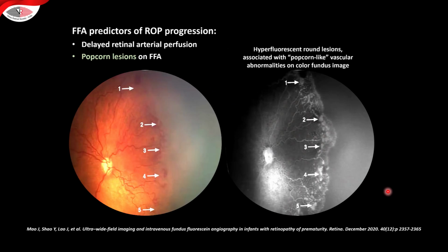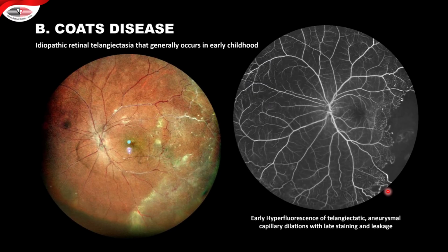FA is a good tool even when you are following up these patients, at times when you decide that should any laser be done, or the anti-VEGFs have regressed it enough, and the child can be left alone after just routine follow-ups.